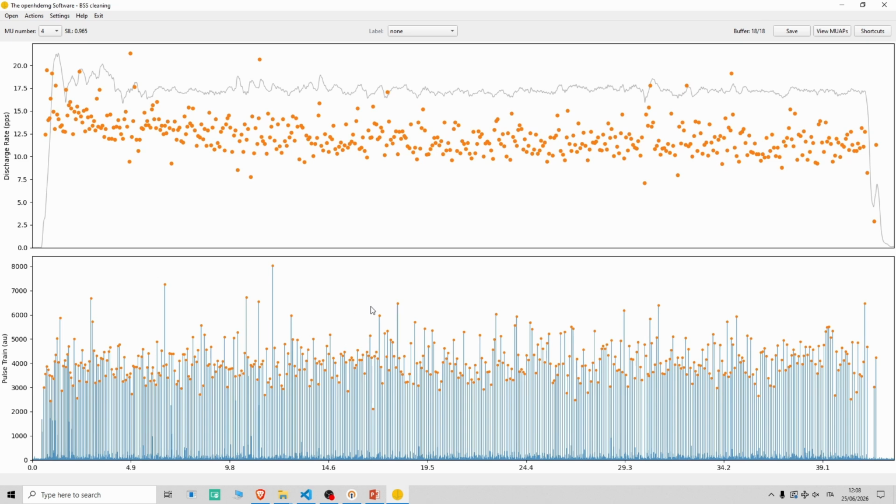And then one of the major parameters, last of the major parameters that we need to take into account when we do motor unit cleaning is, until now we just checked visually, so it was absolutely completely subjective, but it's also the silhouette threshold, which is the accuracy measure proposed by Francesco in 2016, and it goes from 0 to 1.